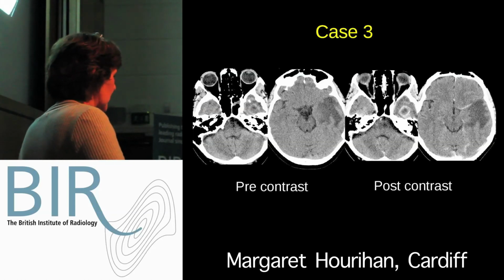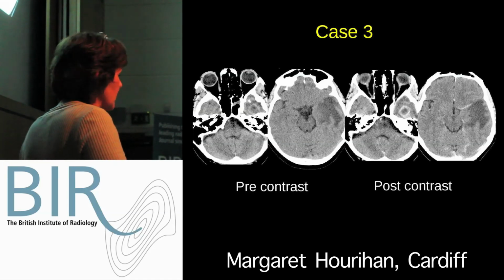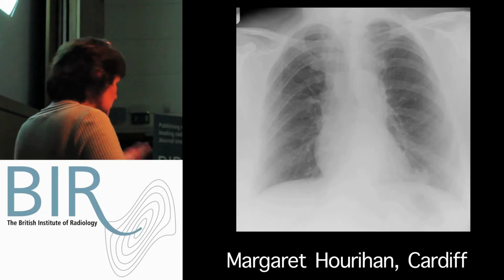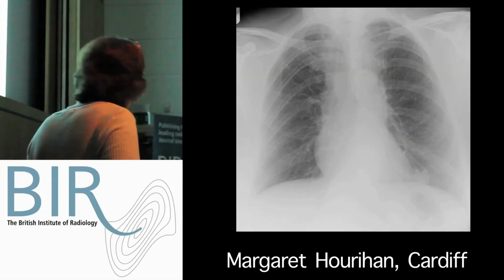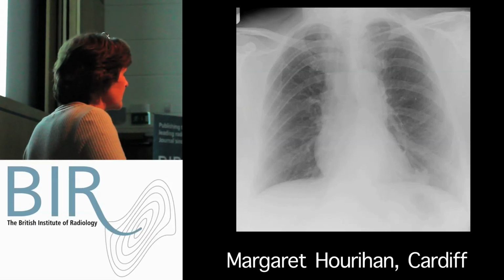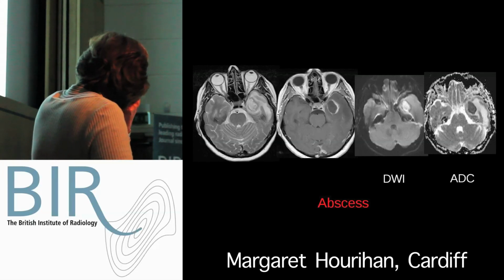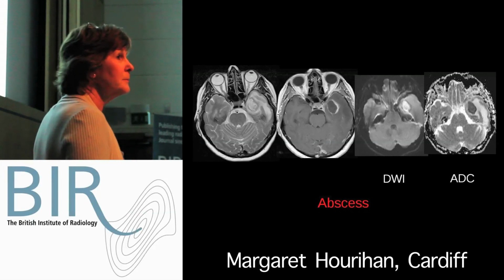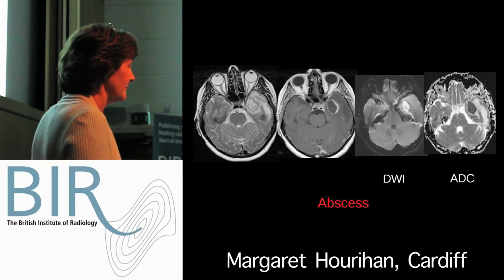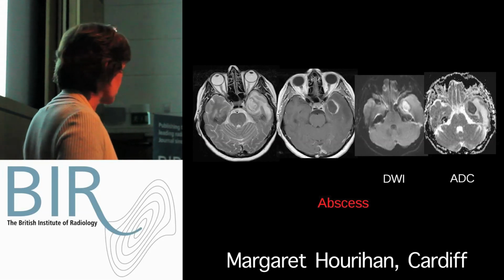Okay, this is a recent case that came into the neurosurgeons, I think the weekend before last, with a ring lesion. There's a differential diagnosis for ring lesions, we've discussed that, and that's the chest x-ray. So she was sent over with a temporal metastasis that could be excised because of its location. But anybody got a clue? Yeah, you can see the prominent vessels there.